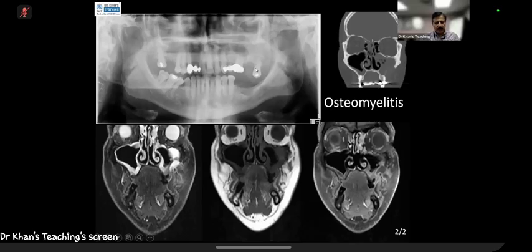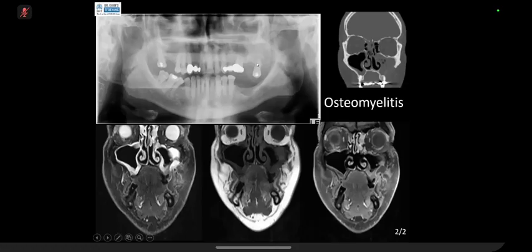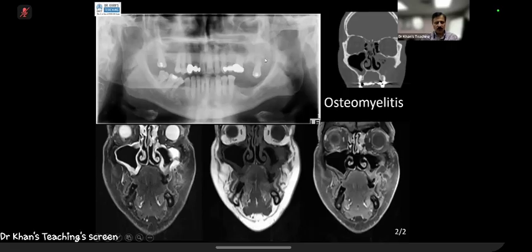So here the learning point, the exam point, is that look at this tooth here and look at this tooth. Now from here to here is the crown, and this is all eaten up. There is no crown. And this is the root. And there is a bit of lucency even here, what we call a radicular cyst. So there is infection of dental origin.